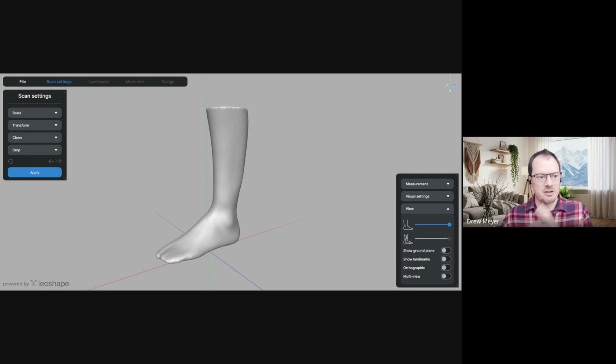I want to touch on how to use the software and optimize your exposure within it, whether you're doing a CNC workflow or a printed workflow. To orient you to the software, it is a guided workflow. You walk through the steps up here, starting with an import screen.